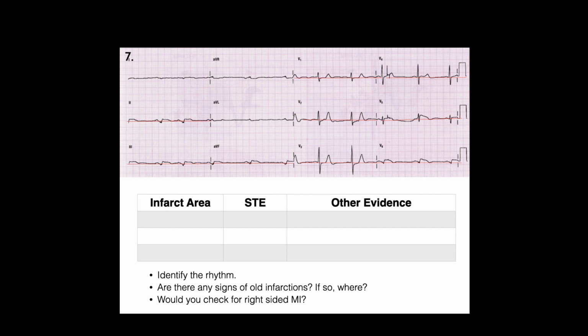So you go off a lead two, correct? Well, any lead that's helpful to you, right? The thing to really check is regularity, because even though it changes shape, it's really one 10-second rhythm strip. So you can take your calipers and check regularity. Actually, AFib is one of the easier ones to pick up on a 12 lead, because you can see if it's regular or irregular.